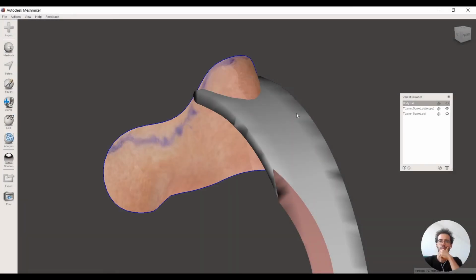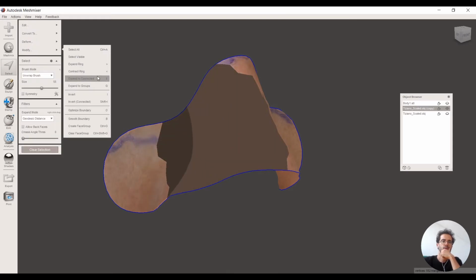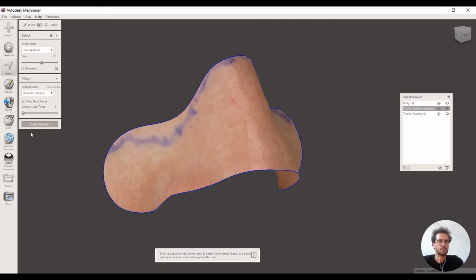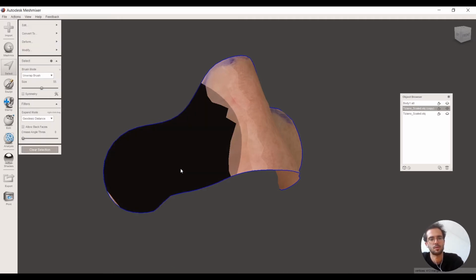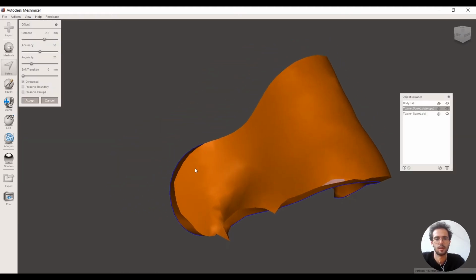So switch back to what I was doing, this piece. I'm gonna do just one thing to check. Modify, expand connected, modify, invert selection, and delete. Okay, clear selection. Okay, I was probably having some hidden triangles somewhere. Right now, we select again everything, so Command A, and edit, offset, and now it's working much better.